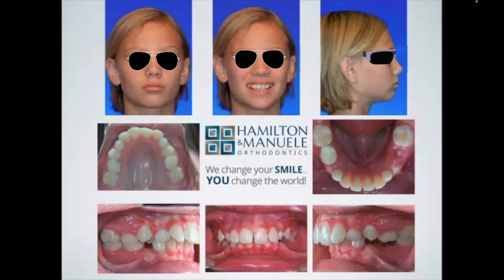So overall, just start with your orthodontic diagnoses. What are you seeing? Just spit out something that you're seeing on here. Anything potentially out of the range of normal.